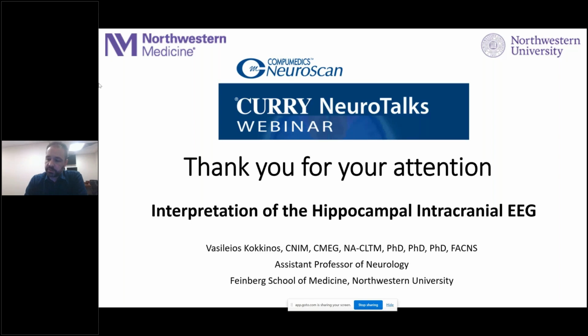and we see more or less the same differences in these groups, because sometimes we're implanting those patients bilaterally, and one of the hippocampi turns out to be not so active after all.